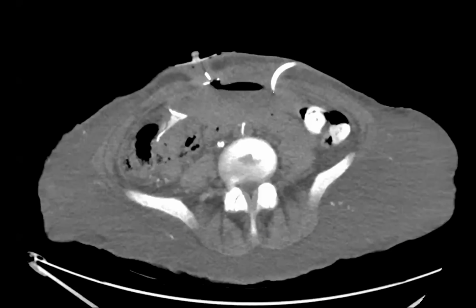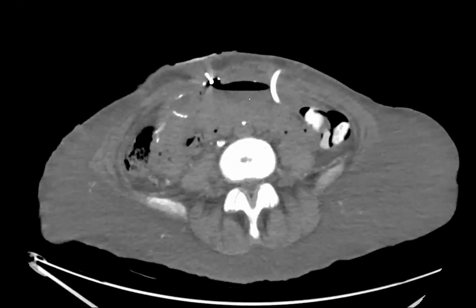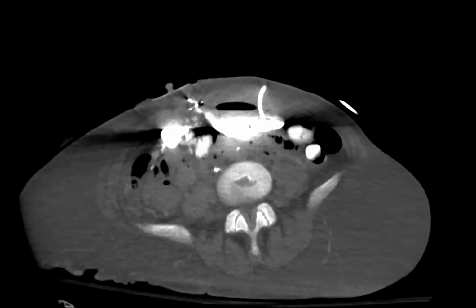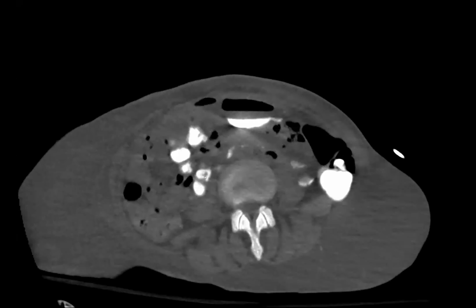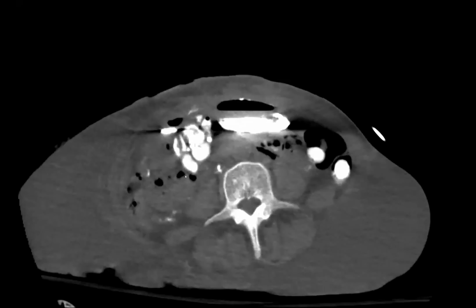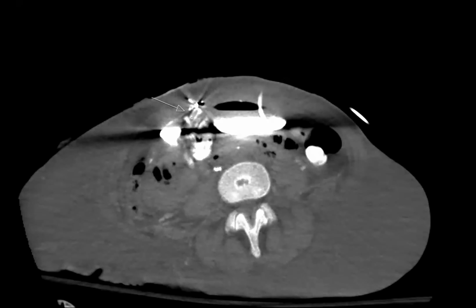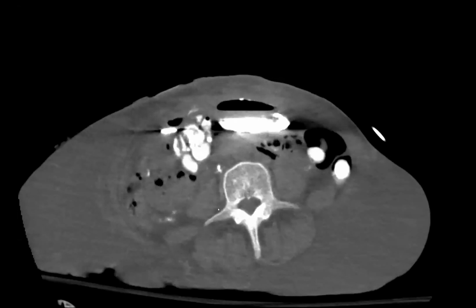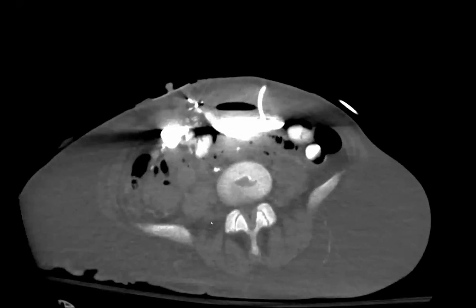In this particular case, it did not work because there was not a direct line to just a small hole in the small bowel. It was leaking out into a fluid collection that then went out into the skin. There was a pigtail catheter in this collection, so they injected contrast into it a little while later, and you can see that the contrast is frankly communicating with small bowel loops. So in this case, the enterocutaneous fistula plug was communicating with a fluid collection, not just a singular hole in the small bowel. Therefore, it did not work. But anyway, just so you know that this device exists.